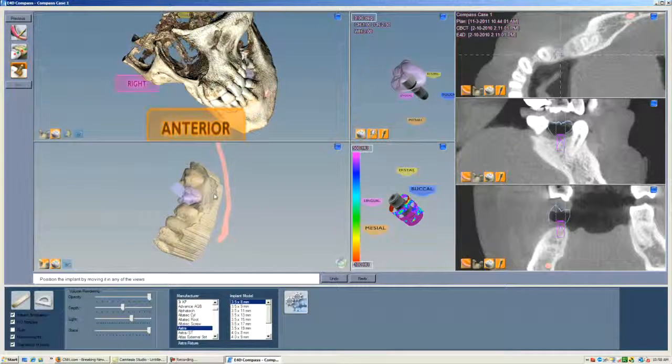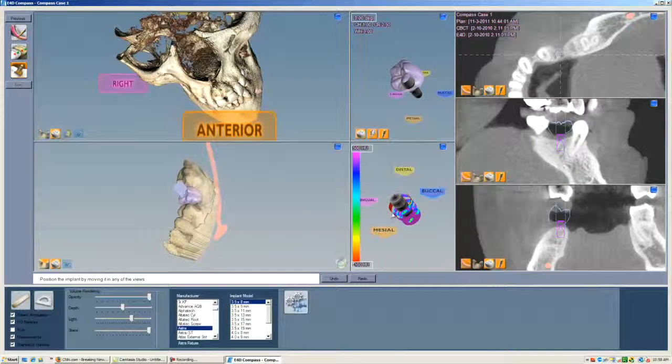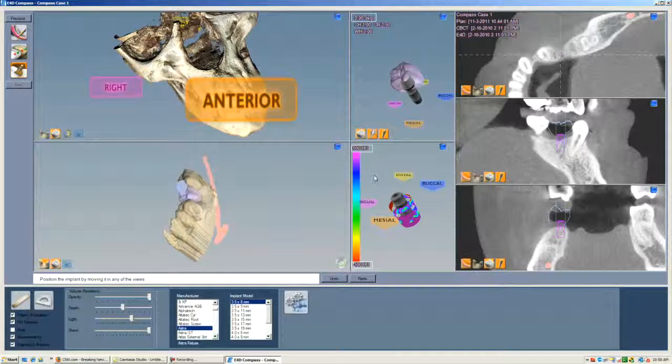Now straight away you'll see it's just given you an optimum location of what it thinks. And now looking at the restoration, you've got your Hounsfield unit here as well, so you can watch both. You're looking at all of these at the same time. And obviously, I'm no expert on placement of implants. You'll do a much better job on this. I'll just show you how you can actually move it and place it.